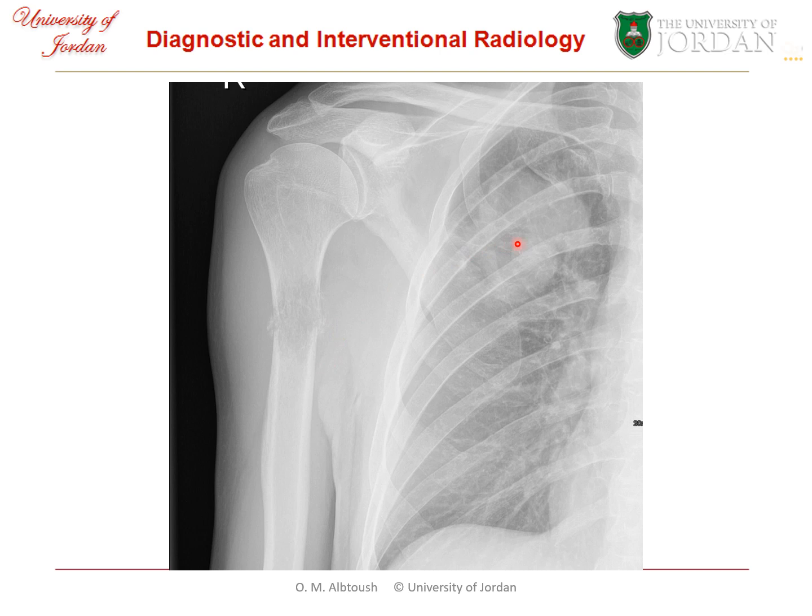In this case, for example, please also, in any plain radiography reporting session or reporting film, have a look at all regions. So here, as you can see, we have a right-sided lung mass with this fracture, so it can be due to a metastatic process complicated by fracture, and this patient's first presentation was the fracture.